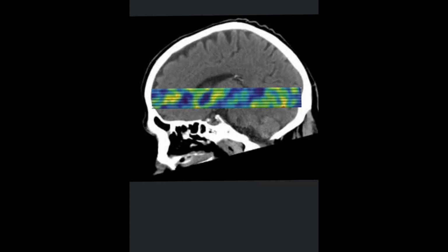The first slab is usually at the level of the basal ganglia, as the ACA, MCA, and PCA territories can be visualized on this slab. Now, fancier CT scans can complete an additional slab just superior to this slab. The technician must be very careful to avoid any overlap of the slabs to minimize double radiation to any brain parenchyma, and also must be careful to avoid any gaps in the slabs in order to avoid missing a stroke.